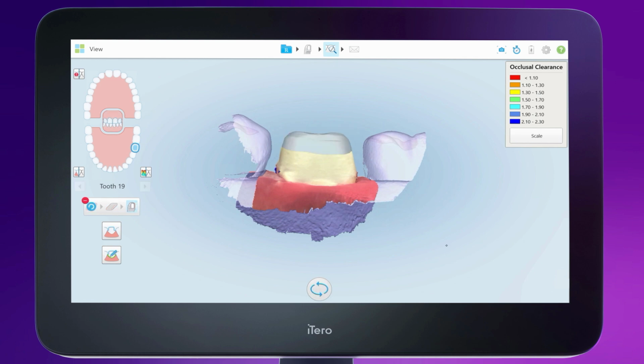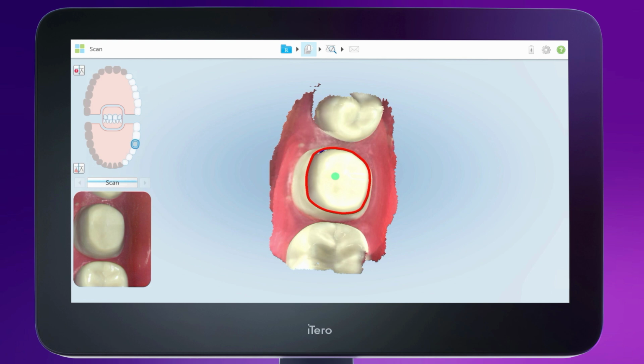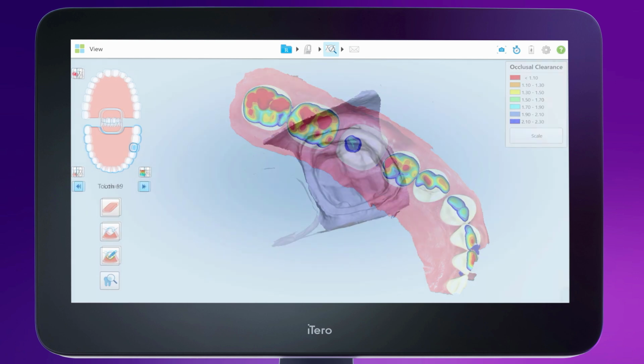After erasing the desired area, tap the sleeve icon to rescan. Make sure to select the sleeve icon that is part of the eraser tool and not the sleeve icon at the top of the screen. Next, tap the View Mode icon to see the modified model.